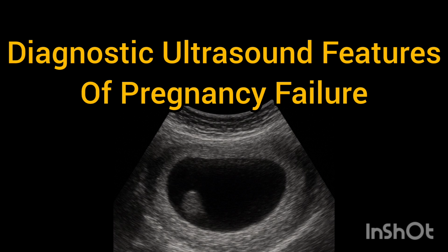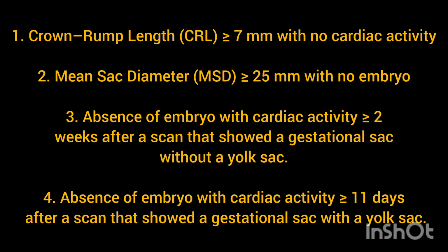These are: number 1, crown rump length or CRL of greater than or equal to 7 millimeters with no cardiac activity. Number 2, mean sac diameter or MSD of greater than or equal to 25 millimeters with no embryo.